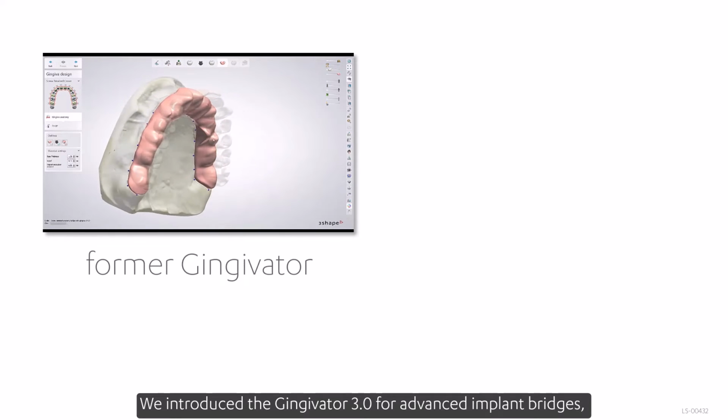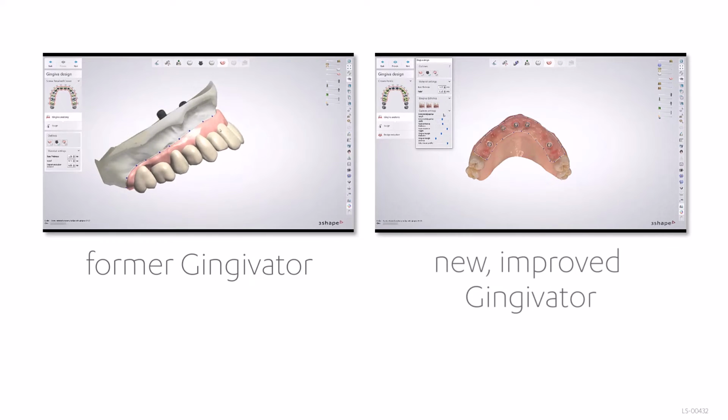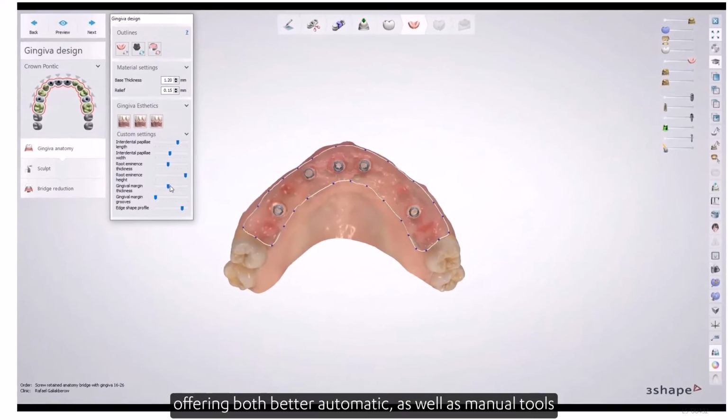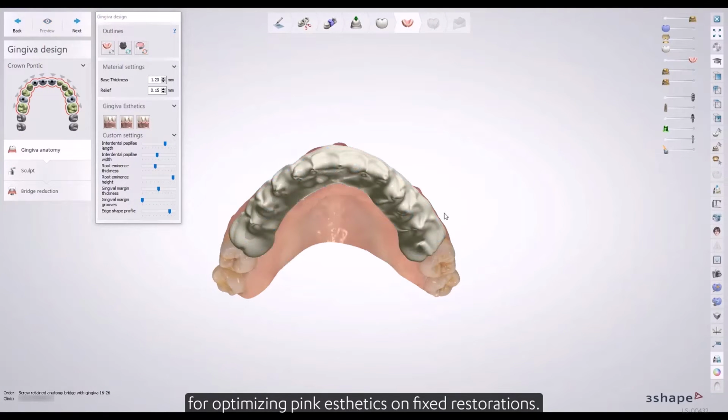We introduced the Gingivator 3.0 for advanced implant bridges, offering both better automatic as well as manual tools for optimizing pink aesthetics on fixed restorations.